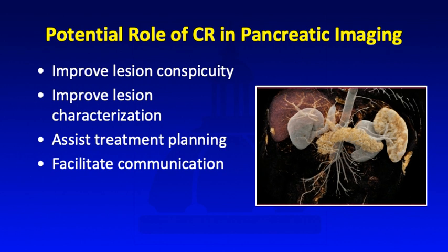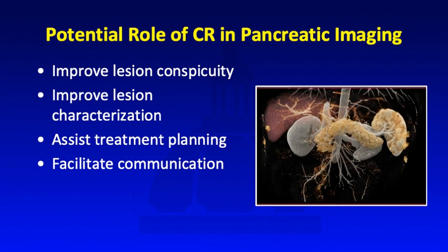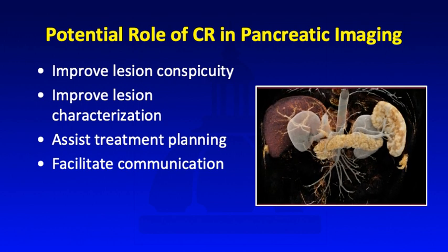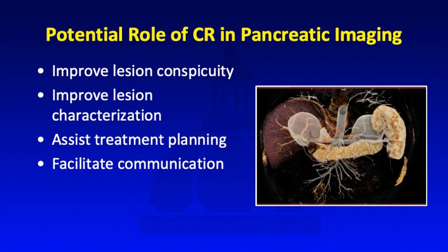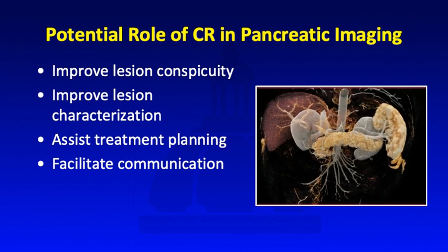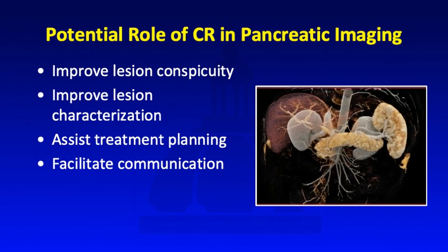And then we will shift focus to talk about the potential role of cinematic rendering in pancreatic imaging. And a lot of the potential applications are similar to liver. But I want to show you this video with the normal anatomy of the pancreas, see how you can really appreciate the lobulated nature of the pancreas, and you can see really lifelike appearance of the spleen, the liver, and both kidneys.